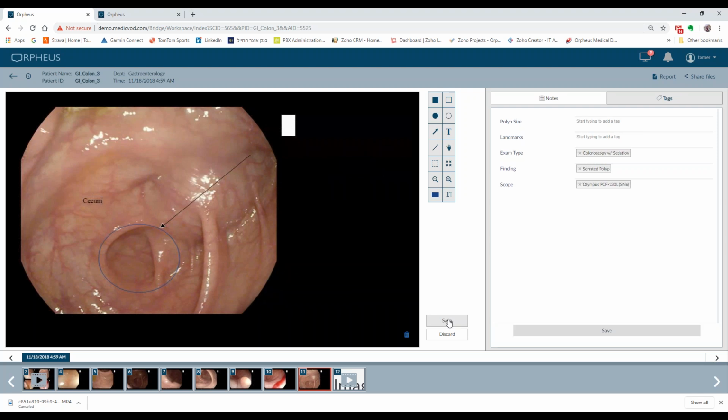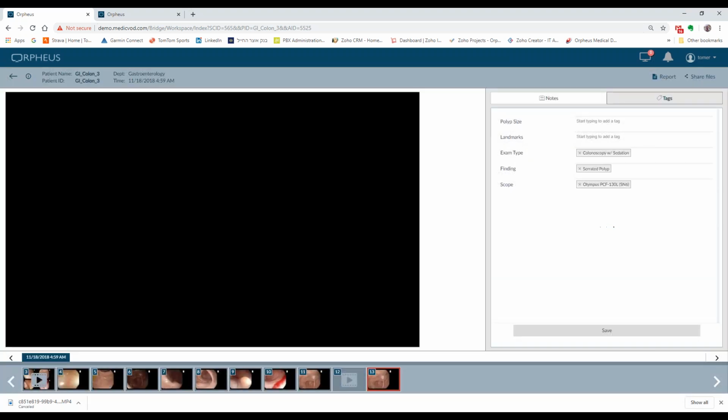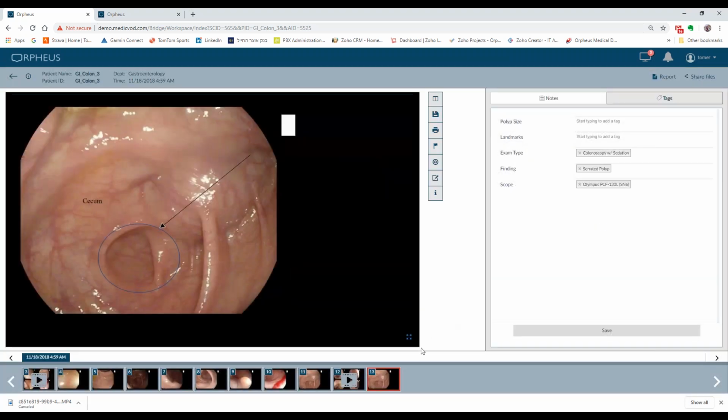Now, if I choose to save this, what we do is we create a copy of the original, and we do not add a presentation layer, if you're familiar with that, like a vector of graphics on top. It's a copy. You can see that it's a direct copy of the actual image. It's related to the source image. We know how to trace it back to the source image, but it's an exact copy.